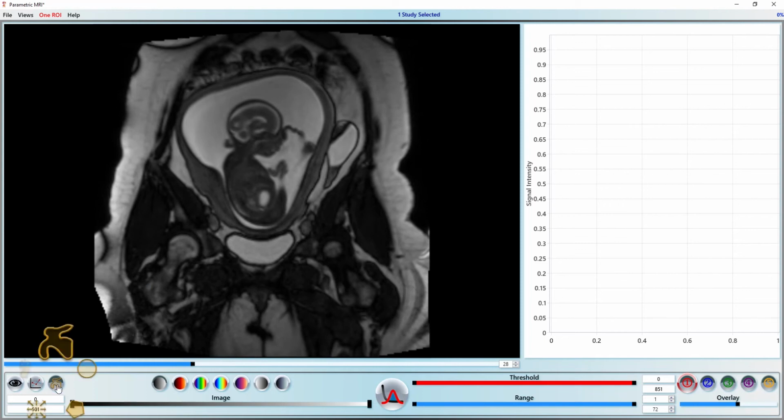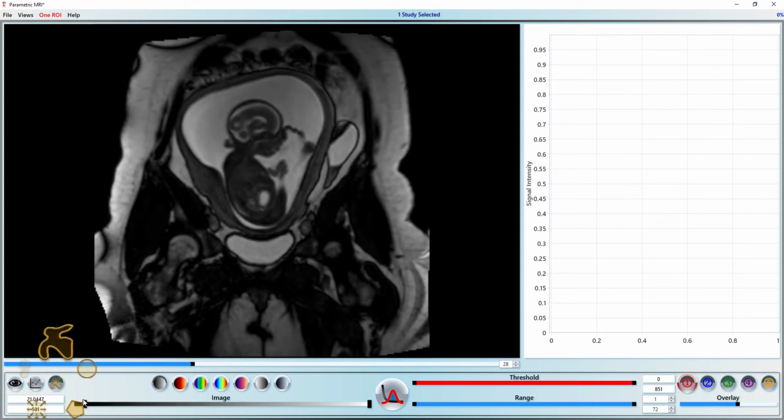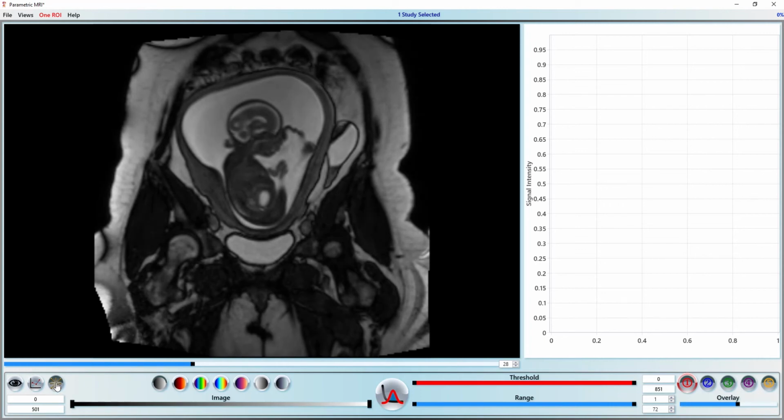Right-click the Draw ROI Mode button or press 3 repeatedly to switch between the different modes. The 5 modes are Freehand, Circular, Polygon, Region Growing, and MRU. The first 4 modes are available for all data types, while the MRU mode is reserved for MRUrograms and will be grayed out otherwise. Let's go through these one by one.